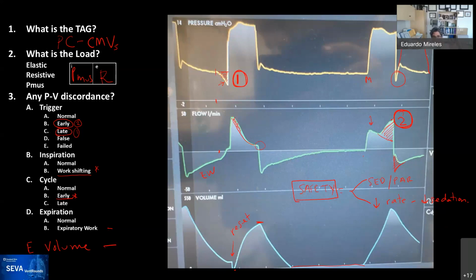So when I see this, I stop and think, what is the cause of reverse triggering? We don't know much, and I'm going to go out on a limb, and this is recorded, so it's for posterity. I would say that in my mind, the majority of these abnormalities of rhythm that we are seeing, either entrainment or the actual reflex trigger of a breath after a mandatory breath, are probably a manifestation of toxicity of the sedation and analgesia that we're using.